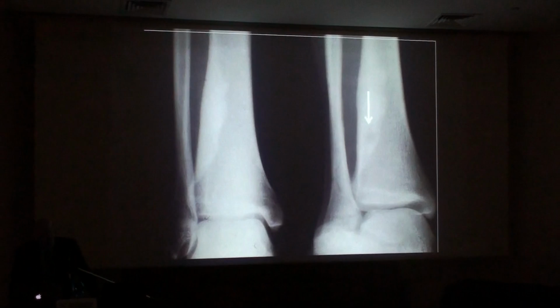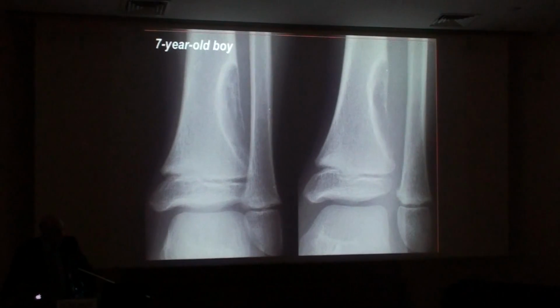And you'd also notice that it's really not completely homogeneous as you'd like to see for a bone island, but certainly the more distal aspect being more heterogeneous in its character. And it's quite characteristic of what we see in these healing or sclerosing fibroxanthomas or ossifying, non-ossifying fibromas.